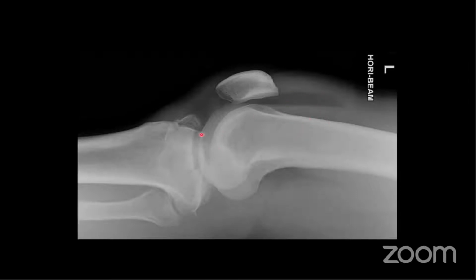So if you see this, you look more carefully at the tibial plateau. You look at the AP view as well, because you might see the fracture there. And if you still can't see the fracture, then the patient needs referral to orthopedics with a view to getting further imaging. We can either do a CT of this or an MR to look for a fracture. But if you see a lipohemarthrosis, there has to be a fracture. If you just see an effusion without this level in it, there might not necessarily be a fracture.